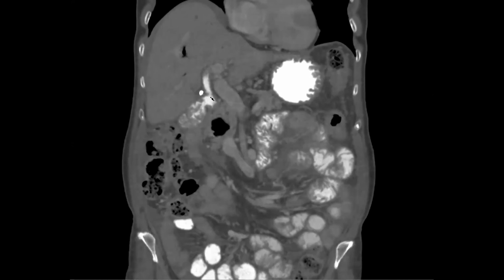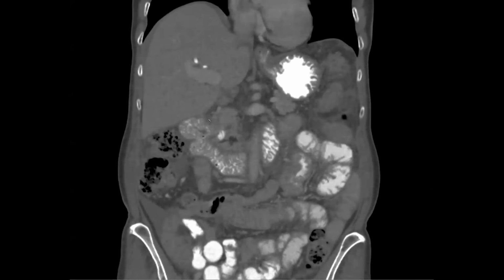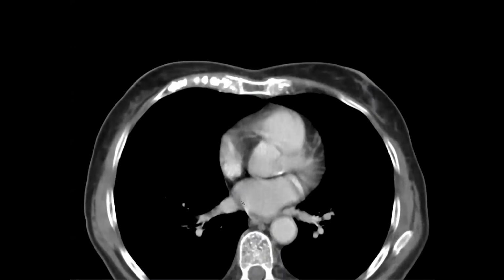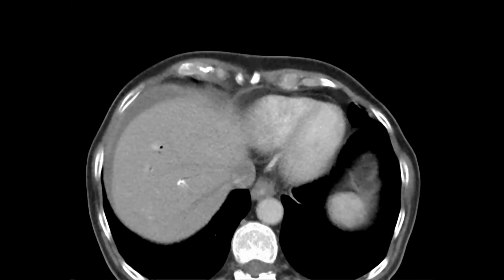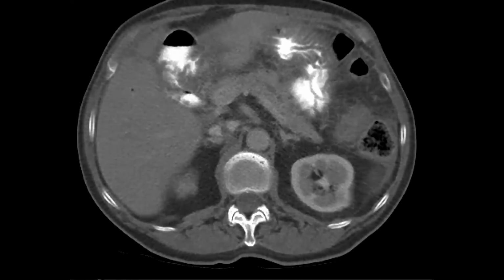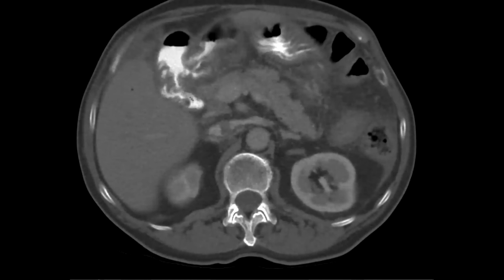So what we learned was that before ERCP, if there was any stricture in the distal common bile duct, they used to do something called a choledochoduodenostomy, where they would anastomose the anterior part of the bile duct to the duodenum. I'll show you on the axials too. So if you ever see this, this is a known surgery they used to do where the bile duct is just anteriorly anastomosed to the duodenum.